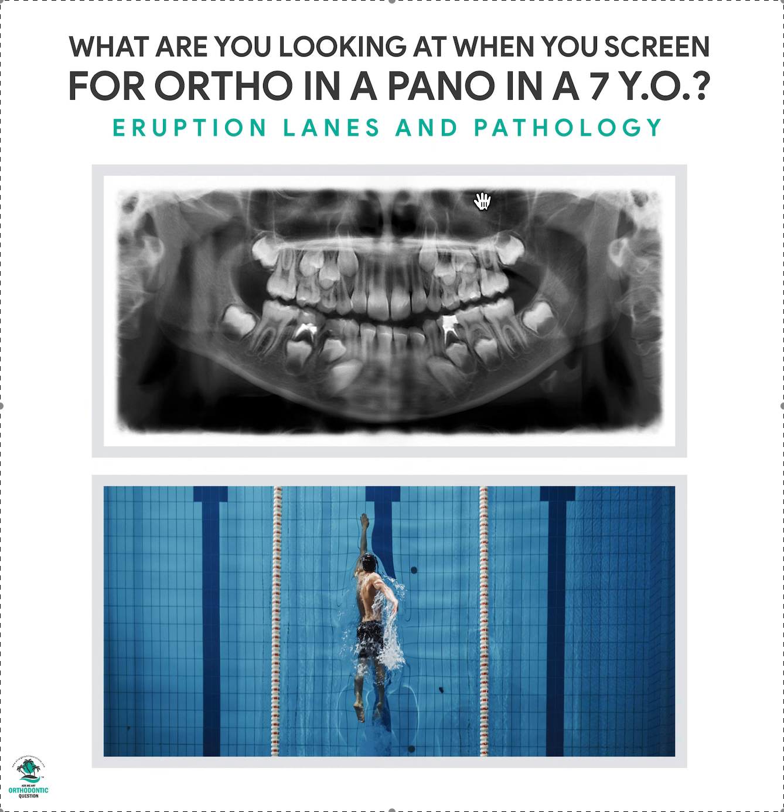There's tons of red flags in this x-ray here, not only the lower threes, but how bunchy the threes, fours, and fives are up here, and the lack of lanes. So just something to look at.